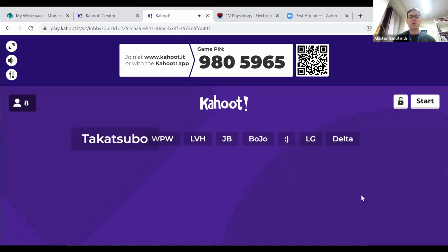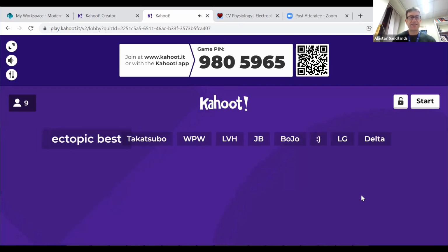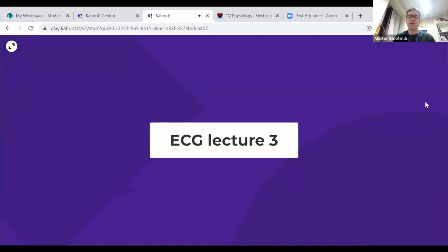Okay, the first few questions are sort of on Takotsubo, great one. Basically, the first few ECGs are on sort of concepts. So 1 to 5 is on concepts. Okay, here we go.